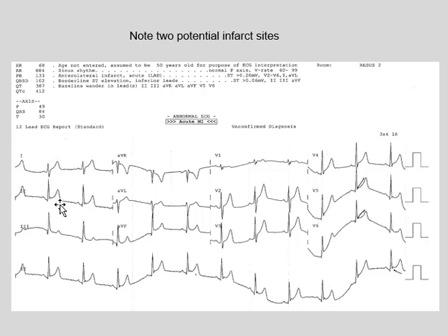It's probably that lead 3 is a little flatter. Remember the rules for determining all this can be specific, and unless you get your calipers out and measure them, which would be impossible without a grid, you might be just within the borderline there, but I would be happy calling this probable inferior infarct. And that word probable or possible or likely are very useful.